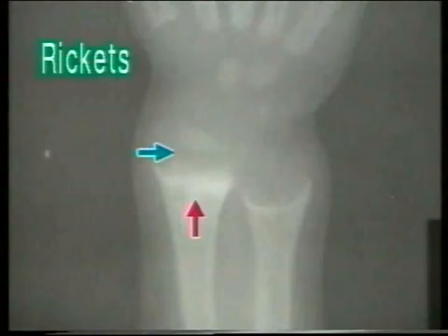This is an X-ray of the wrists of a child with rickets. The wide and cup-shaped metaphysis can be identified from a distance, and note the soft tissue widening caused by the widened metaphysis. Now here, note the increased distance between the epiphysis and metaphysis, shown by the blue arrow. This is a widening of the growth plate. The margin of the metaphysis is blurred and frayed, that is, the line of provisional calcification is disturbed.